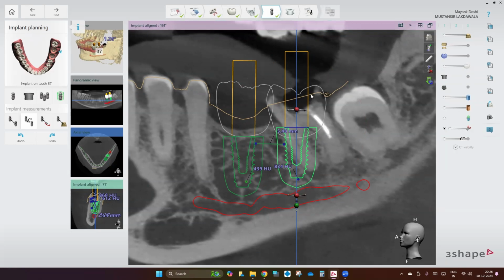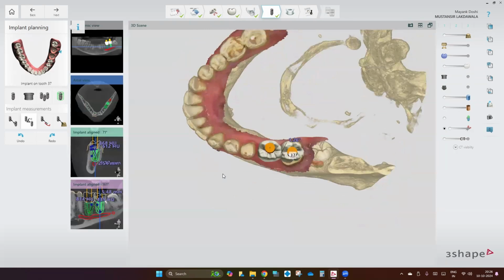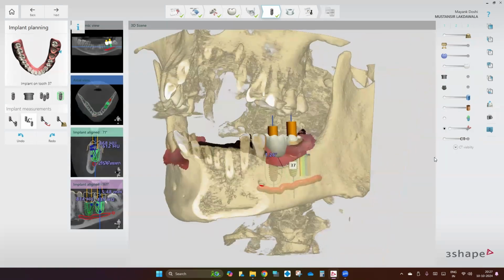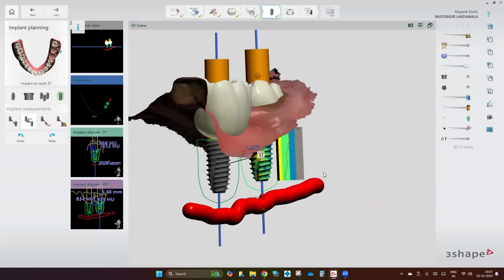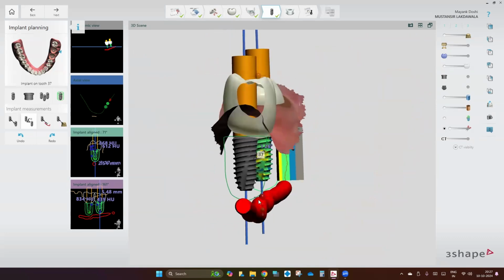चलो, तो आगे बढ़े. Does this position look okay prosthetically also? है ना? Yes, sir. Looks like an acceptable position. Let's do one last thing. Let's get them as parallel as we can. Okay? Now in this case, I have the provision to actually, मेरे पास इतना सारा बोन है, I can align both of them as much as I want.